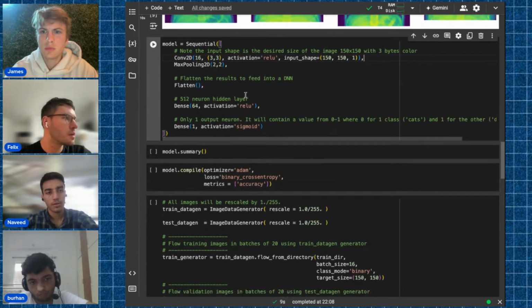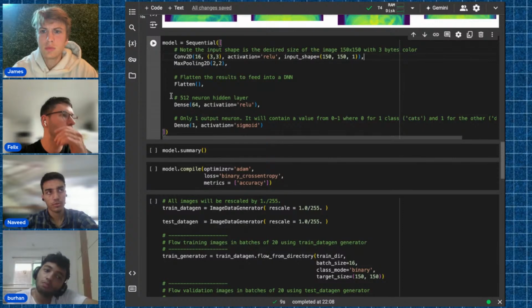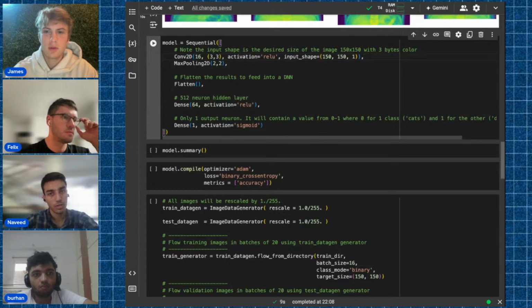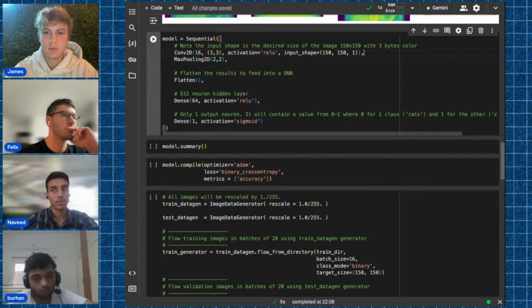All right. And then the output layer stays the same because we are looking at a binary classification problem. That's why we just have a single neuron with the sigmoid activation function, which just spits out the probability of how much it thinks it belongs to class one, meaning the positive class. And then you can threshold that probability to decide whether it's class one or class zero.